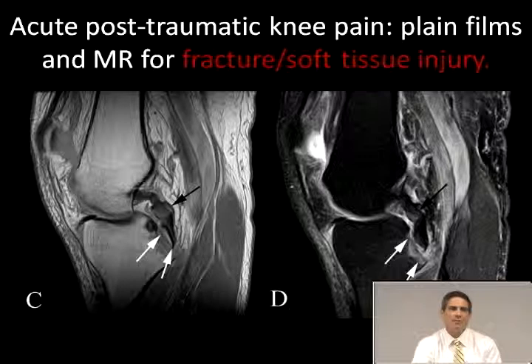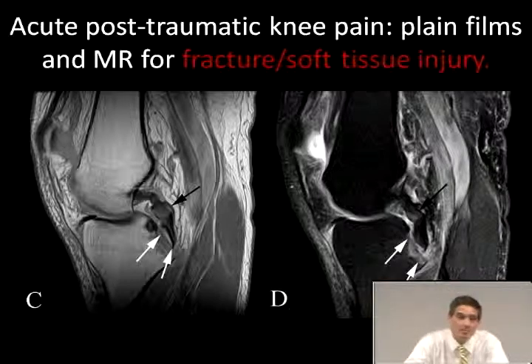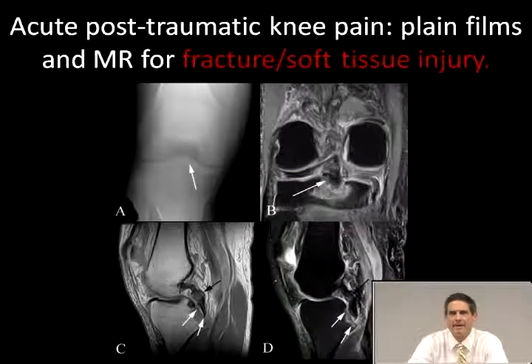Here the coronal MR in B shows you a fracture through the insertion side of the posterior cruciate ligament. Nicely seen here on a lateral study. The patient had intrinsic damage of the posterior cruciate and some avulsion injury of the insertion of the posterior cruciate ligament. Here's a composite showing all four pictures: tibial plateau fracture, bad cruciate ligament injury, and usually these do get surgical repair.